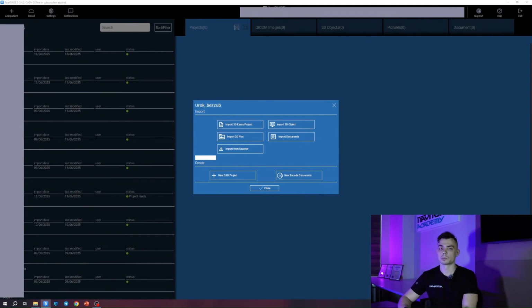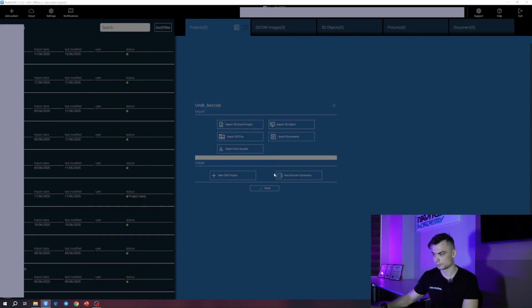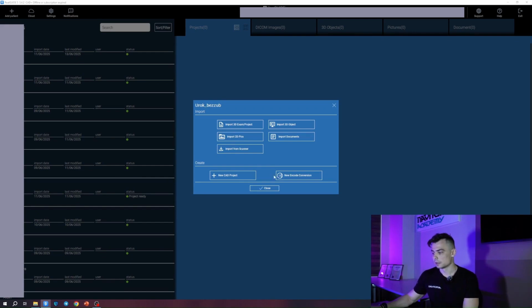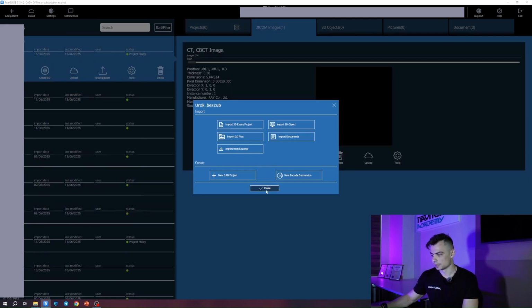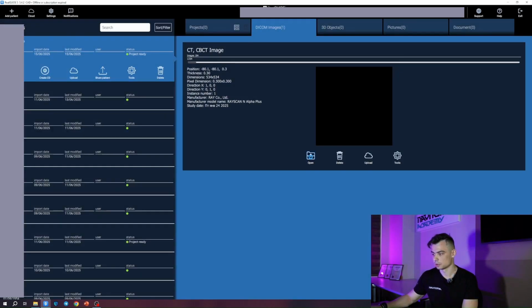Right now, in this case, I will repeat, it doesn't matter at all which CT scan you have, because for our current purposes, it really doesn't matter. We're only doing this in order to launch the project in RealGuide. So while I'm talking here, my project is loading. All right, it's loaded. Now, let's open it. It's called Edentulous lesson. It just needs a moment to render, and then I'll open the program.